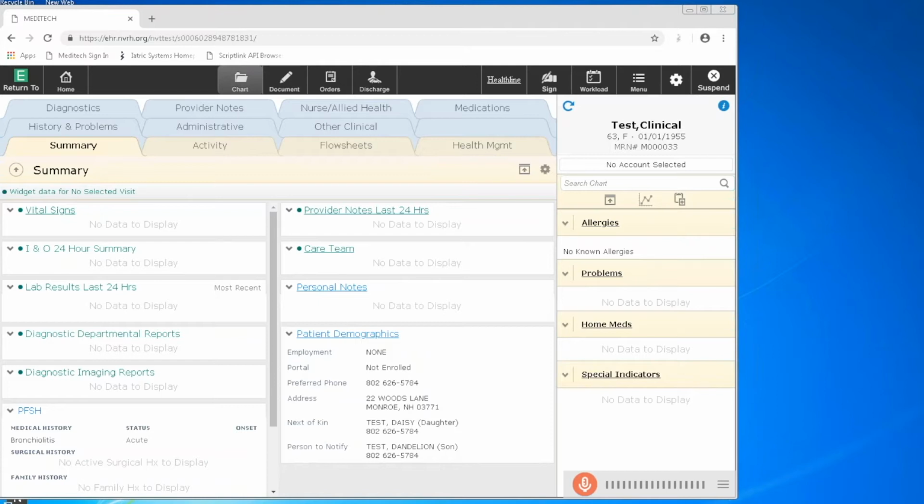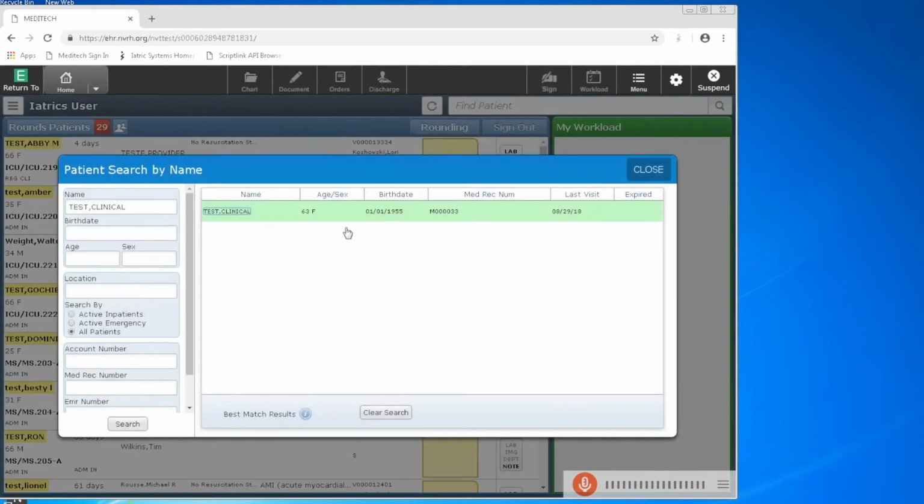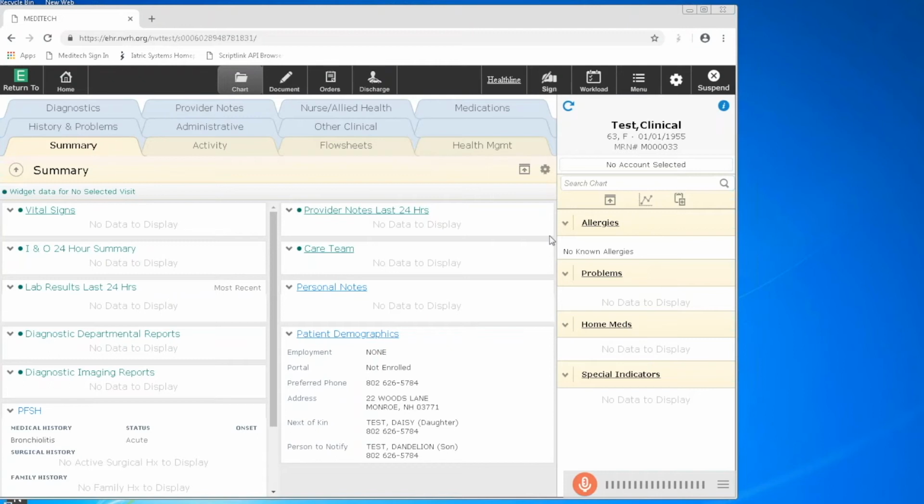Access to the EKGs is achieved by the use of a stored procedure. So let's take a look at this in action. The user identifies a patient within the MEDITECH Expanse application, chooses the patient, and clicks Open Record.